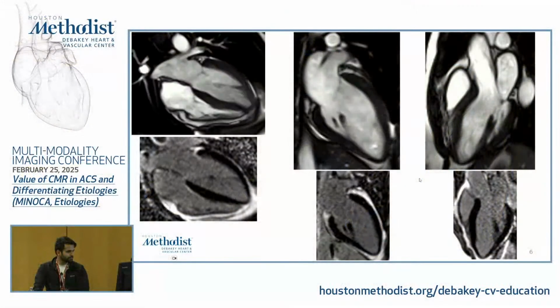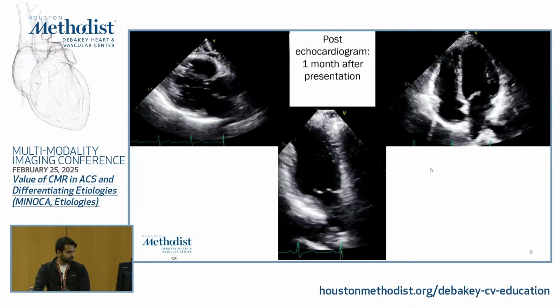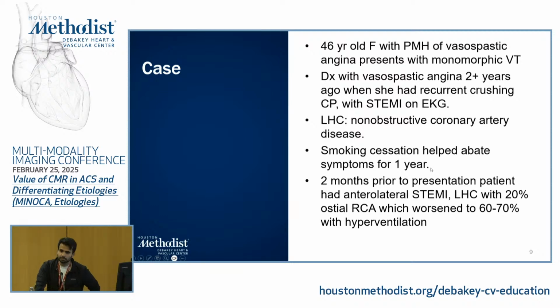And so that wraps up the first case. I think, do we really need the MRI here? In retrospect, if in a different center you don't have MRI available, echocardiogram actually was enough for a case like this, which takes me to the next case where MRI really does help a little bit.